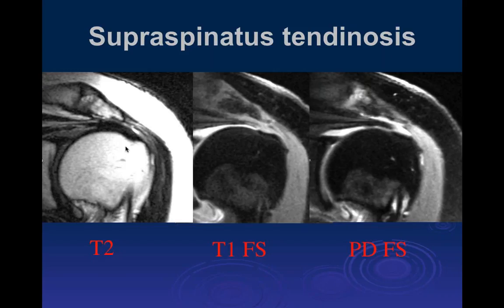This patient went to surgery. There was no rotator cuff tear here. The rotator cuff looked normal, and he ended up having the diagnosis of impingement syndrome with subacromial bursitis as the cause. So this is probably tendinosis of the tendon, enough where it absorbed contrast. In this particular case, the T1 was done first. By the time they got the T2, there was probably more adsorption of the contrast by the abnormal tendon, but the tendon was completely intact, and the synovium was intact, and it looked normal at the time of arthroscopy.